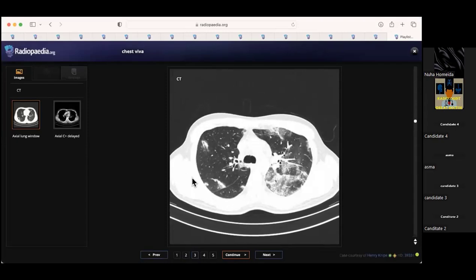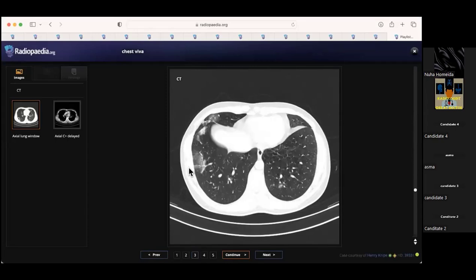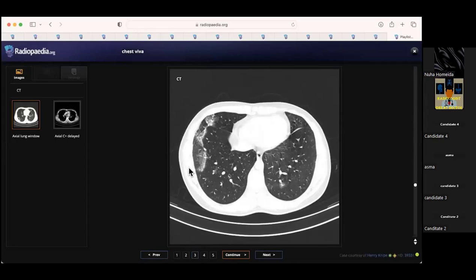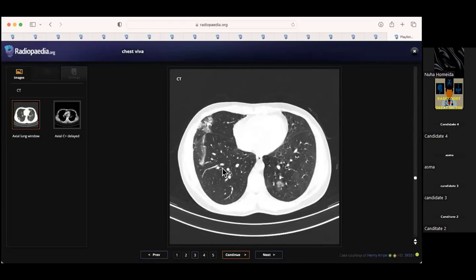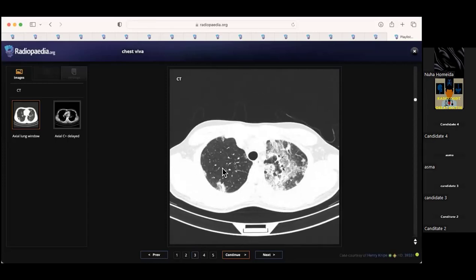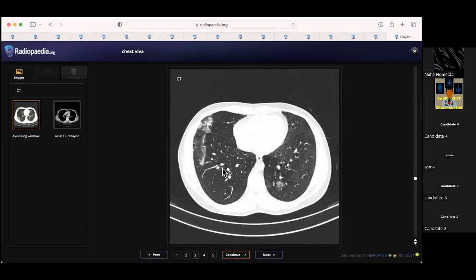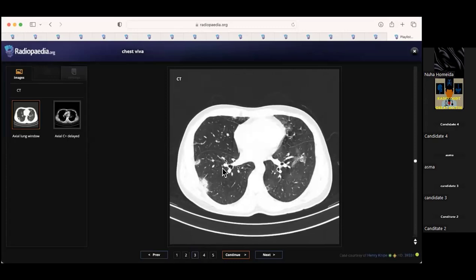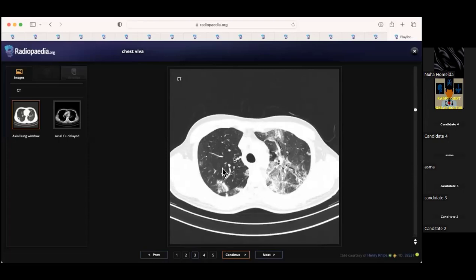So does it help you? Yes, this is a high resolution CT scan. I can see that there is widespread ground glass change noted peripherally in both lungs, more pronounced at the left upper lung lobe, with mild changes of bronchiectasis. This could be due to scleroderma.